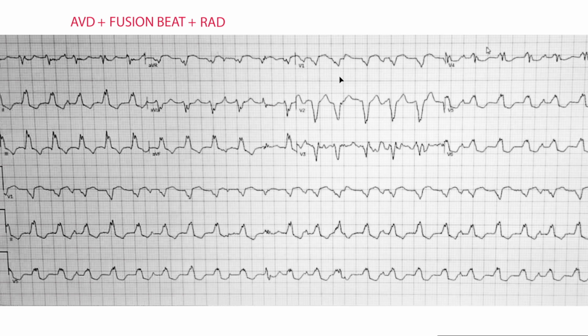So you might have the presence of a bundle branch block, which we would call an aberrancy. But not to confuse the subject at hand, going back to left bundle branch morphology, I'm using the Brugada criteria. I don't have the exact criteria up on the screen, but you can look that up. One of the characteristics in the Brugada criteria is if you have a notching.